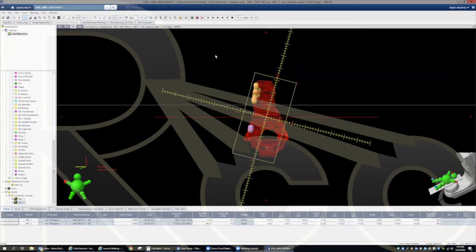And you can look at the other beam. Now you can see that I'm catching all of the beam in this view. Slightly missing here, but that's okay. And I've caught everything the whole time.